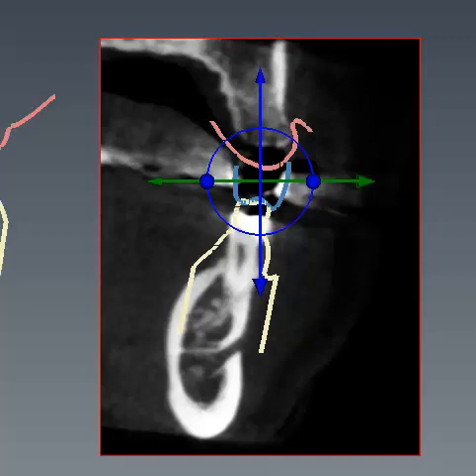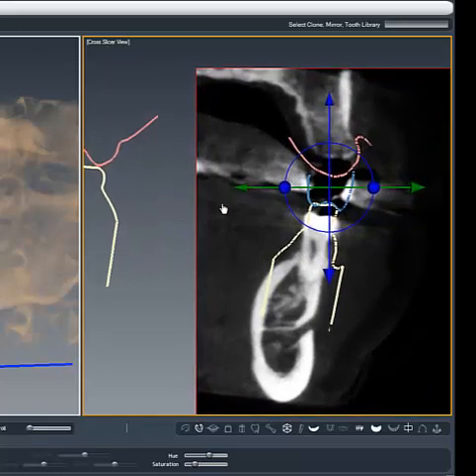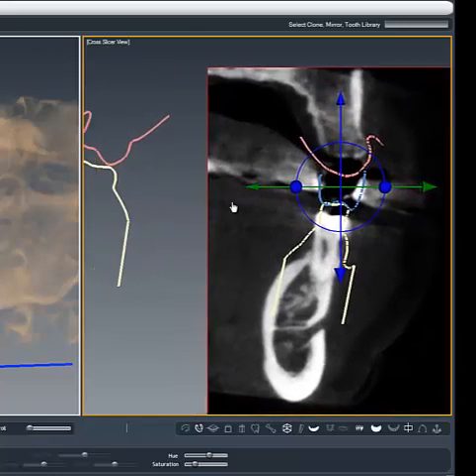As you can see, this is the load that goes into that tooth where we're going to place the implant. The system calculated on this side the position of the load that's going to load the bone right here, and as you can see, this is going to be right smack into the center of the bone. Now the system will automatically snap that implant into the load vector position and position the implant in the maximum possible place within the bone. So let me proceed and go to the implant planning next.